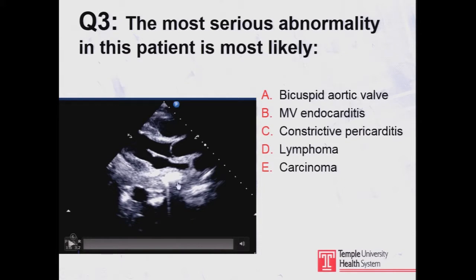But what you should see here is behind the left atrium a large mass also containing gas. And that's that high reflectile right here. And so this patient has esophageal carcinoma. There's air in the esophagus, and that's right where the esophagus is. I was sent a study just last week of a patient who had this bizarre mass behind the left atrium, but you could see that in the subcostal, it was a hiatal hernia and multiple loops of bowel in the posterior mediastinum.